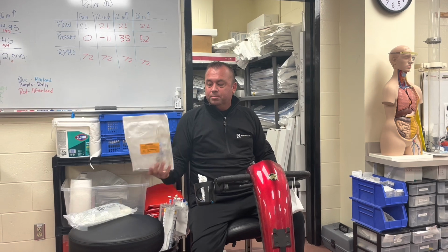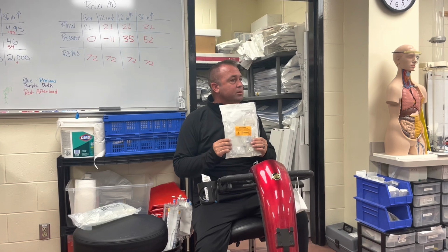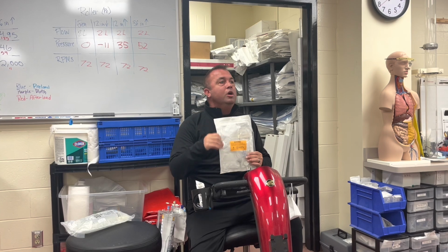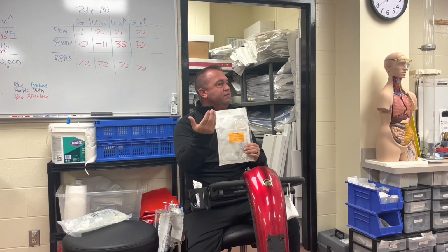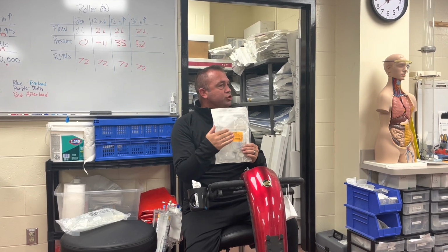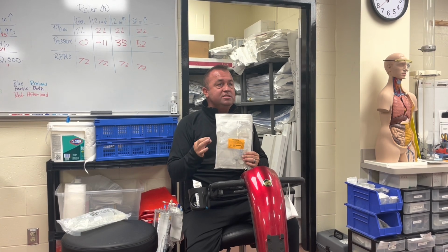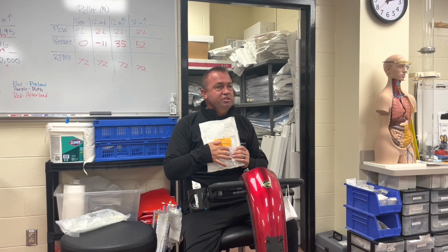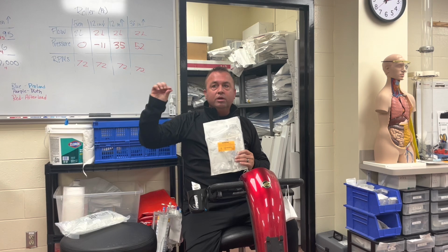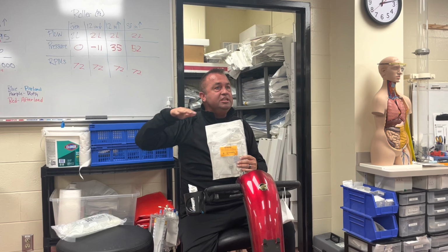Pressure is measured by a pressure transducer that is connected somewhere to a vessel, which could be extracorporeal circulation tubing, or a vessel in the body, that converts a resistance across a membrane to an electrical signal. That electrical signal is called a piezoelectric signal that converts here in the transducer via a Wheatstone bridge. Remember that Wheatstone bridge, to a plug-in that then goes to a monitor that gives us a readout in pressure on a continuous line.